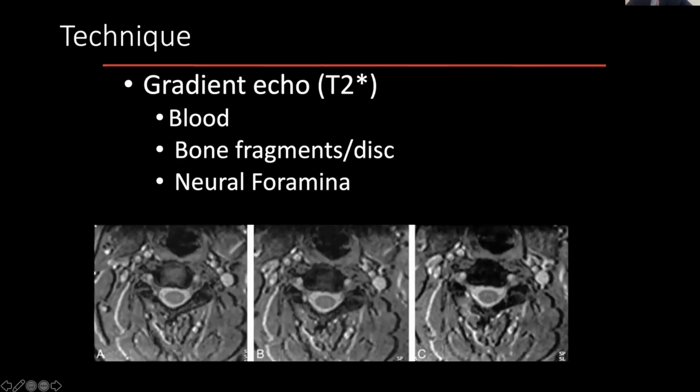Gradient echo, and we have multiple variants on a lot of these themes. So again, I'm really showing you the basic sequences here. You'll see a number of variations. So for example, you might see a sequence that isn't labeled as T2, but maybe it's labeled as FLAIR, or it's labeled as STIR in the case of the spine. And what that is, a T2 sequence which has been adjusted in a certain way to either remove fat or to remove the physiologic water. So the only bright signal you're seeing is from pathologic edema, as opposed to water from, say, CSF.